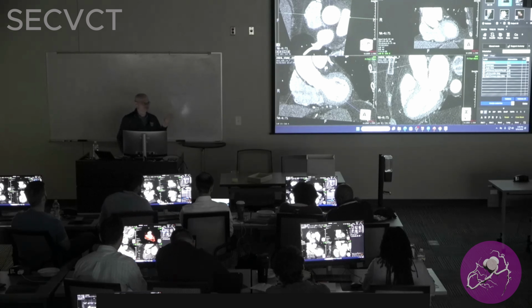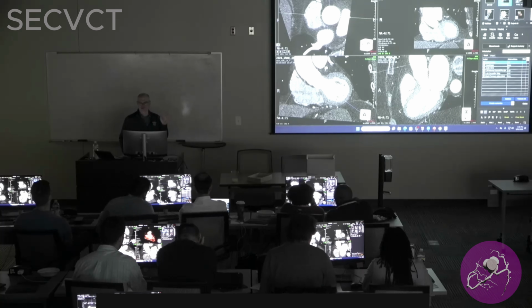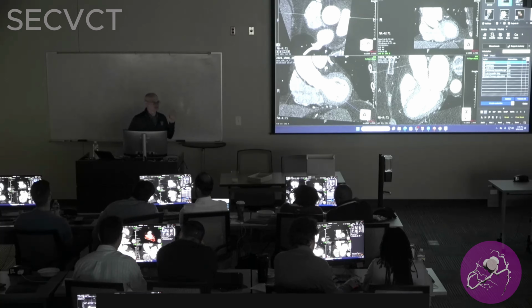Now, the original protocol for where you measure the ascending aorta, I think, is like 5 millimeters. It's some ridiculously short distance, and it underestimates the dilatation of the ascending aorta. So I will almost always measure the ascending aorta where it's largest, which is generally by the right pulmonary artery, okay? The valve companies will measure it very close to the sinotubular junction. And in a lot of people with aortopathy, that will be just flaring out, so it will be borderline. But be sure to do an extra measurement where the aorta is actually largest, even if it's on your CTA image.